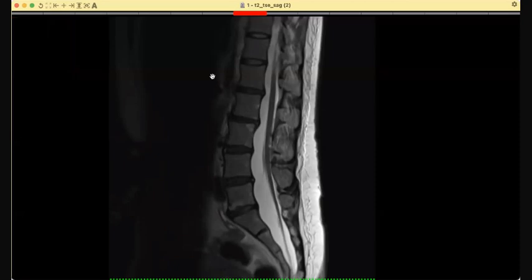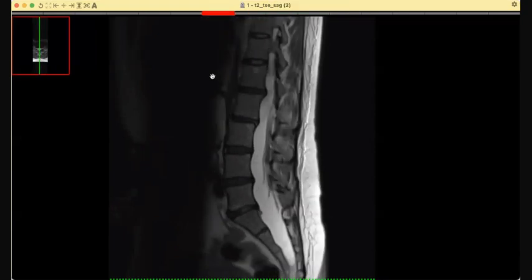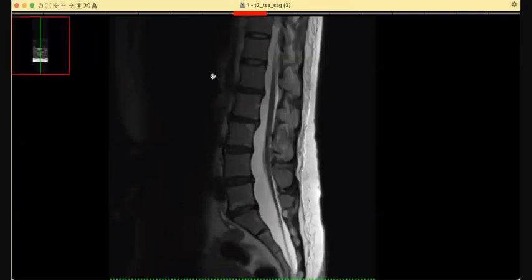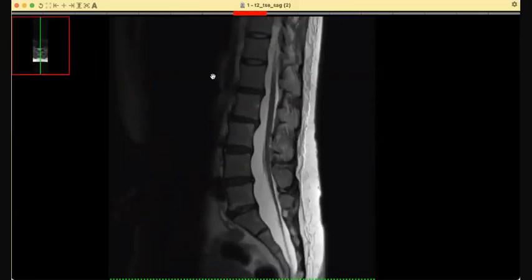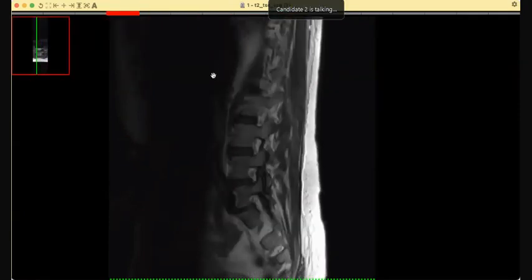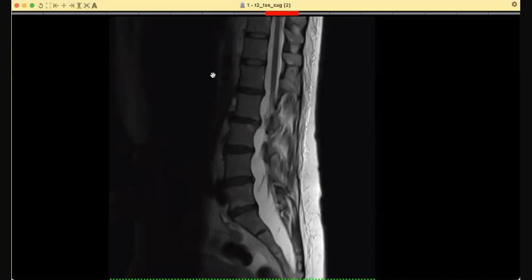Why to the neurosurgical team? What will they do? For further imaging, to look at other sequences and reconstruction, to look out for a lateral meningocele, for neurofibromas, and for surgical resection of these tumors. Also for the brain, to see if there is any CNS brain affectation as well.